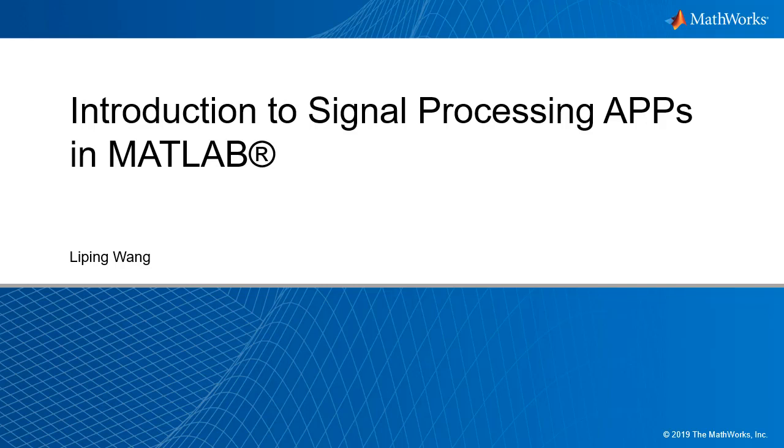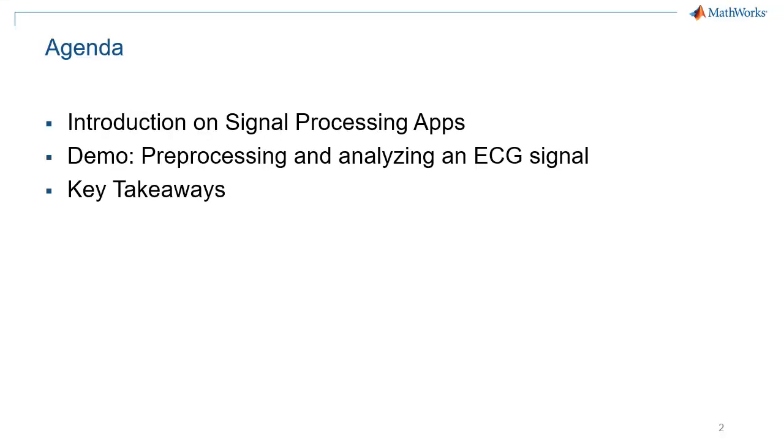Hello everyone, in this video I will share with you how to use MATLAB apps to do signal processing. First of all, I will briefly introduce some signal processing apps provided by MATLAB, then show you how to use these apps to do signal processing through a demo called Preprocessing and Analyzing an Electrocardiogram, the ECG signal. And last, there's a summary.